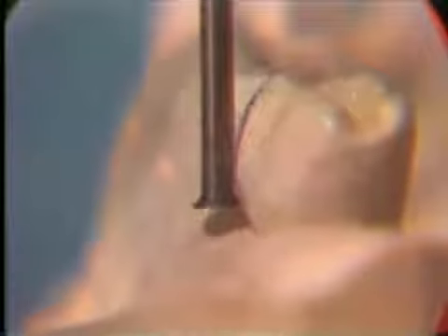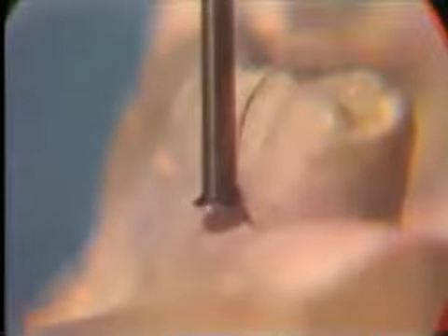First, it must be parallel to any existing or prepared guide planes, such as the lingual of the molar. Next, the correct amount of retention must be determined on the existing or prepared teeth so the crown you make will be in harmony with them. A cast circumferential clasp will be utilized on the molar, and you must ensure that 20 thousandths of an inch of retentive undercut is available at the mesial buccal of that tooth. The cast should be tilted, always making sure the lingual guide plane is parallel until you have obtained the 20 thousandths of an inch retentive undercut.